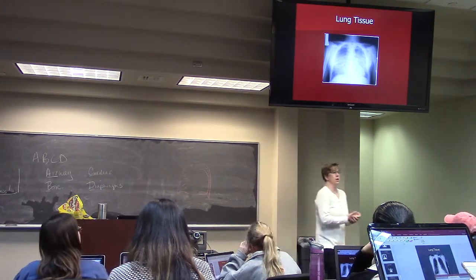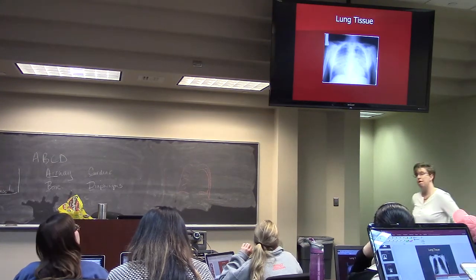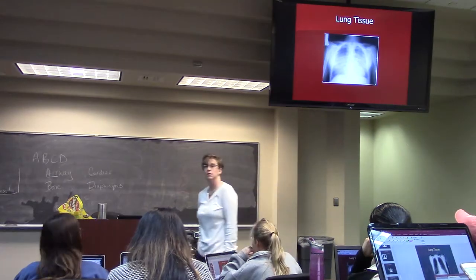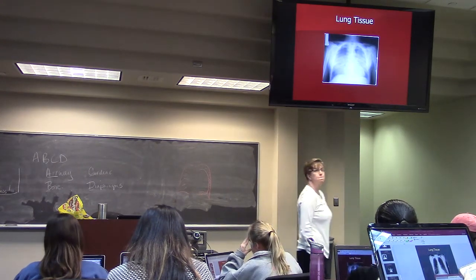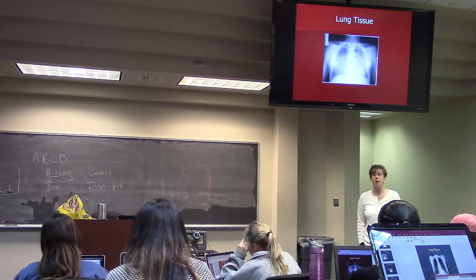What's different about this picture? The heart's really big. Infiltrates, more opaque, increased density. It's more opaque.